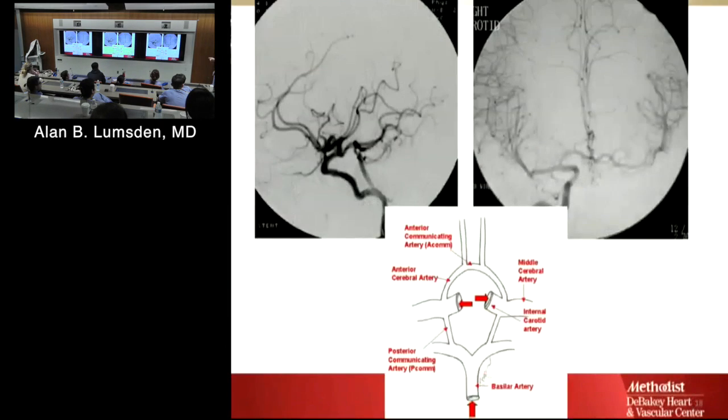Yeah, so, right upper corner. What is your diagnosis based on this? So, what are you injecting? It's an AP view injection. I won't tell them. If you don't tell them, you can look really good. Yeah, very good. And this is what you see when they cross. And this is again injection coming in. You see MCA, ACA coming across, and you see the other. I showed him it yesterday. They have to get it. I lied, I'm going to tell them.